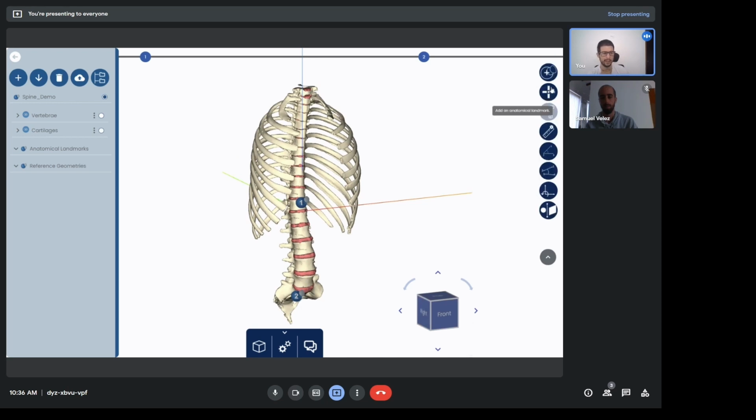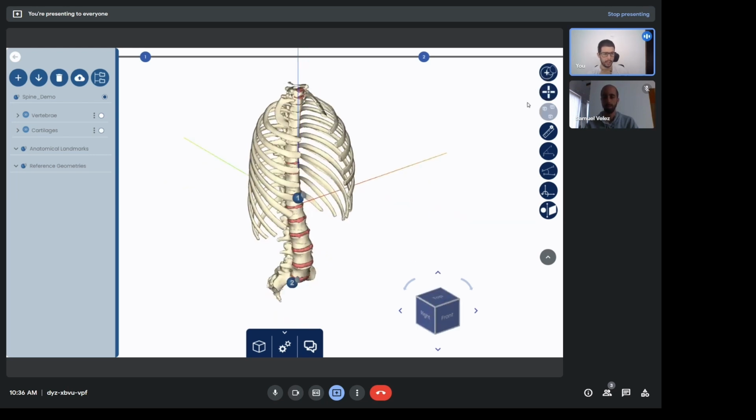The one thing that you want to keep in mind is the open toolbar, the toolbar at the right of the screen. Rather than allowing you to navigate through the application, these will enable different tool sets that will take effect here on the left pane.